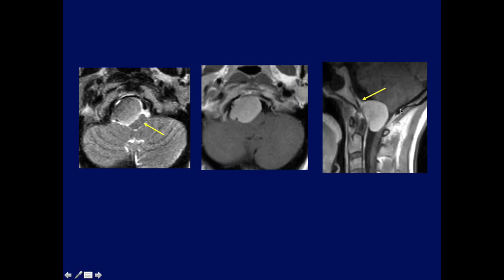And I'm not going to show a whole example of a foramen magnum meningioma. I just wanted to show this large one has a little bit of a dural tail, so it still qualifies as a low clival lesion or foramen magnum. You can see the marked compression of the medulla by this large meningioma.